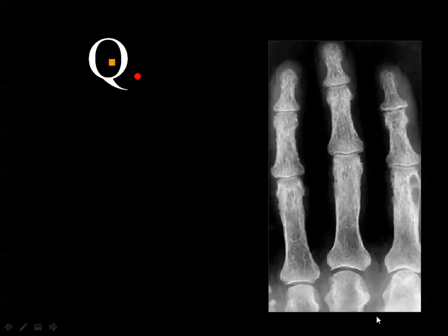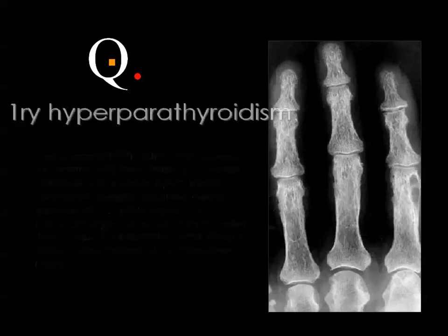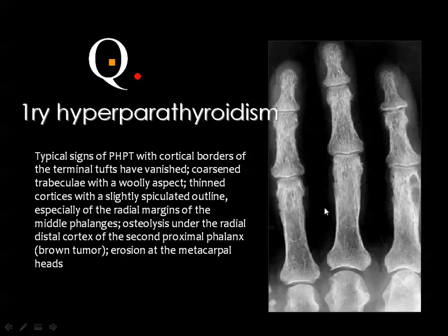Sarcoid. Enchondroma. هايبربارا. يبقى احنا عندنا كذا تشخيص، ساركويد وانكوندروما وهايبربارا. اختار مين فيهم؟ اختار هايبربارا. There is هو مش باين على الشاشة الحقيقة، بس أنا قصادي هنا اللي هو السبر اوستيال ايروسيف changes و resorption of the phalangeal tufts, which are major manifestations of primary hyperparathyroidism.